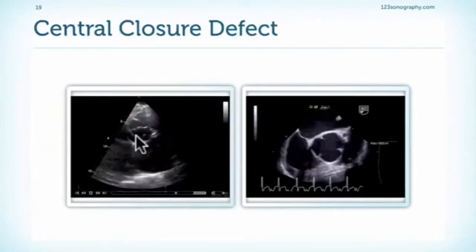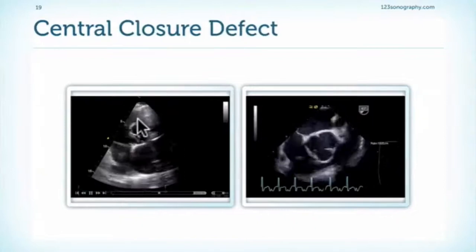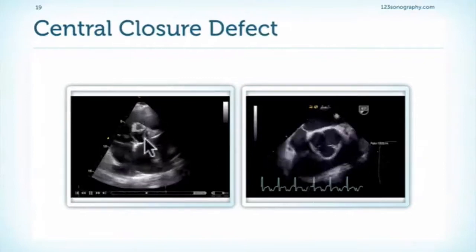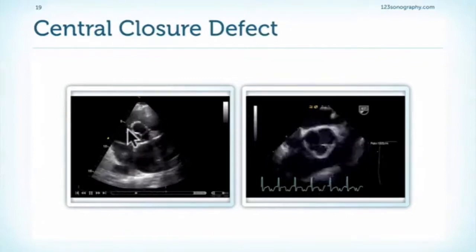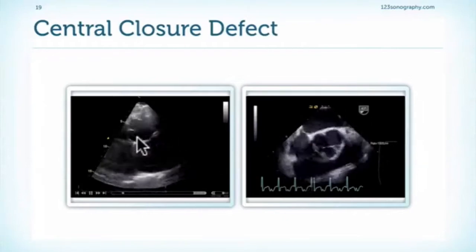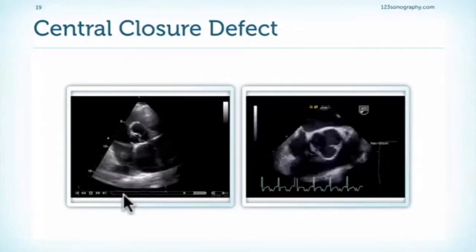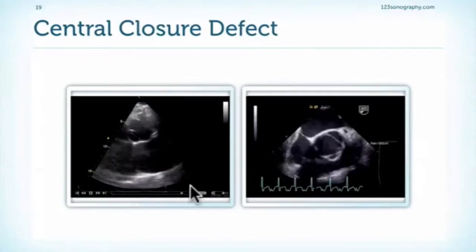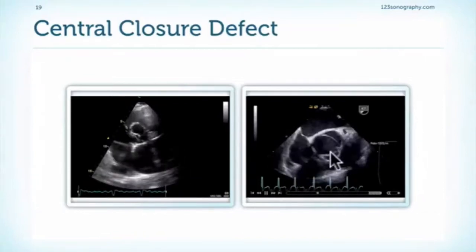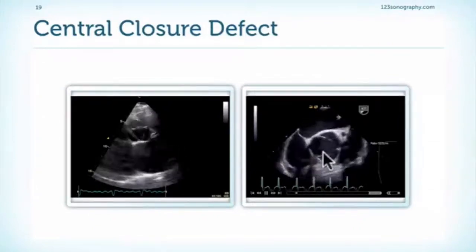This is a finding that you will also see in patients with aortic regurgitation. With 2-dimensional imaging alone, we can actually see the closure defect of the aortic valve. This is a tricuspid valve where the free edges are thickened, but you will see that during diastole there's a small defect here in the region of the aortic valve, which denotes the regurgitant orifice actually. Another patient here who has a large aortic root and 3 cusps shows you a central closure defect during diastole.